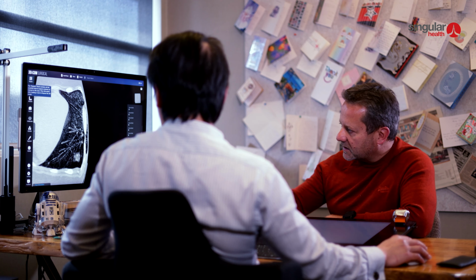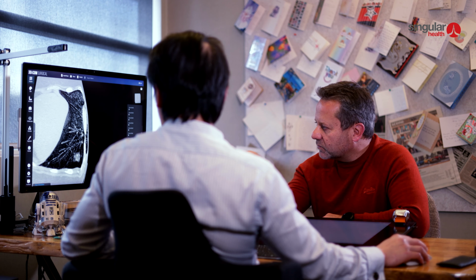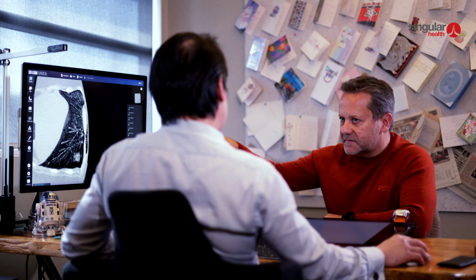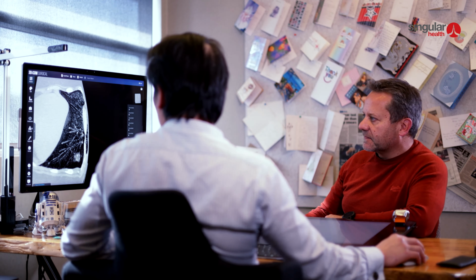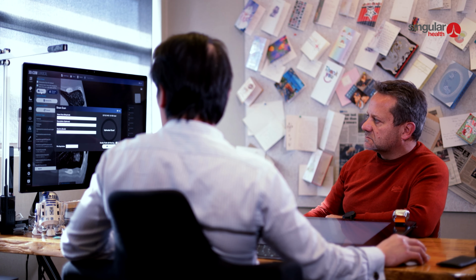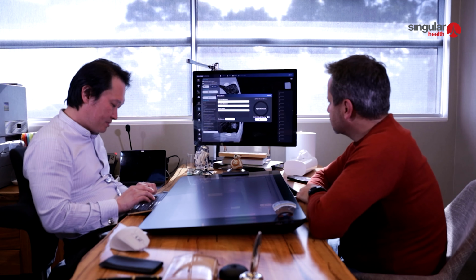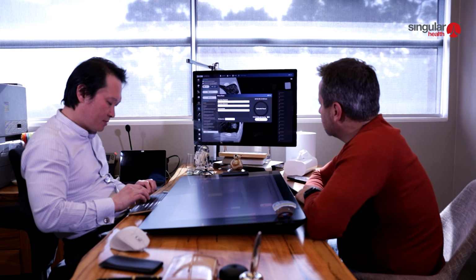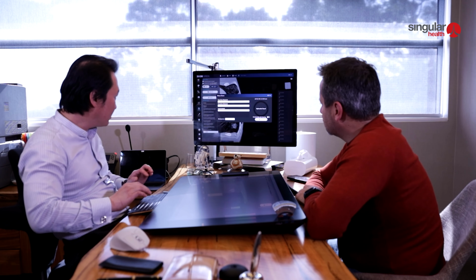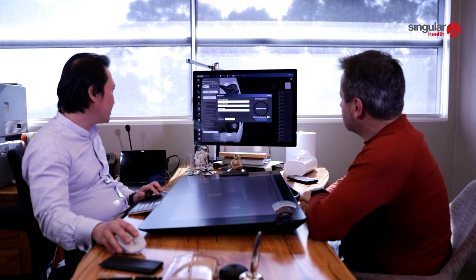And look, when I got my scans from the radiology clinic, they came up on my phone only in 2D, but I'd love to show this to my wife at home and give an idea of what I'm looking at here. Is there any way I could get this onto my phone? Yep, I'll just share that for you. What's your email? thanley@singular.health. Okay, I'll just send that to you.